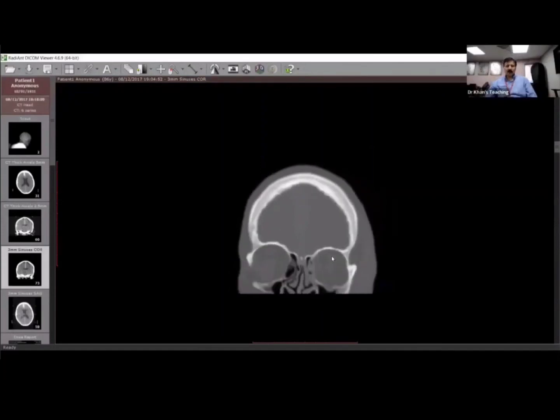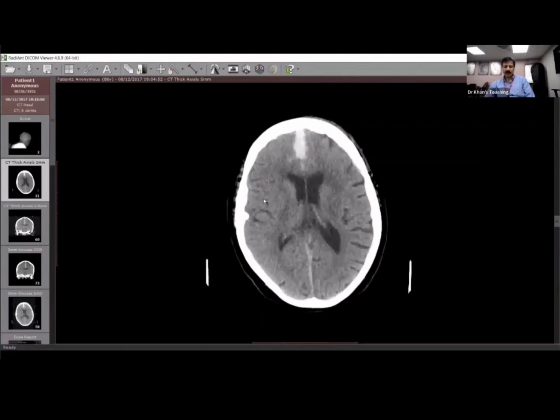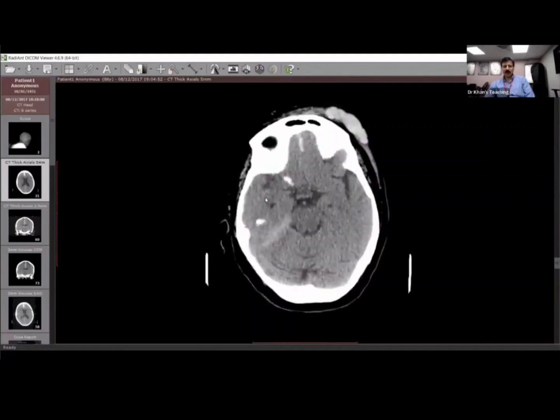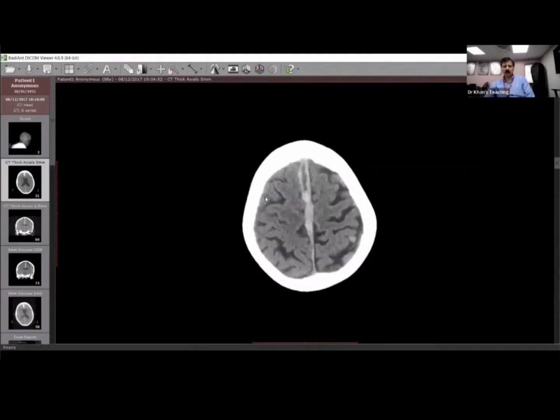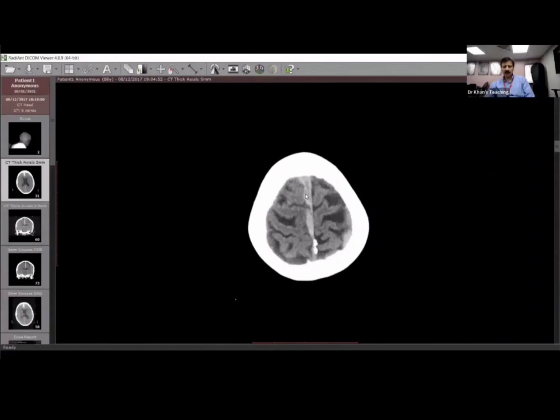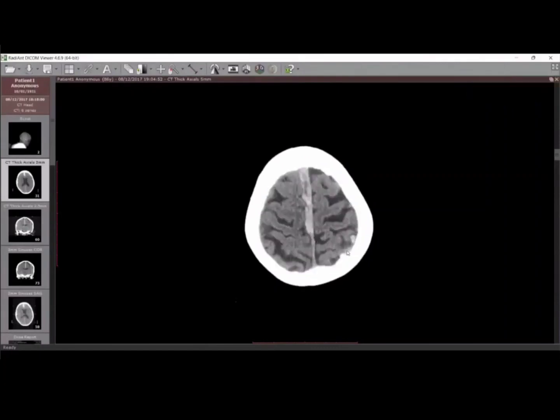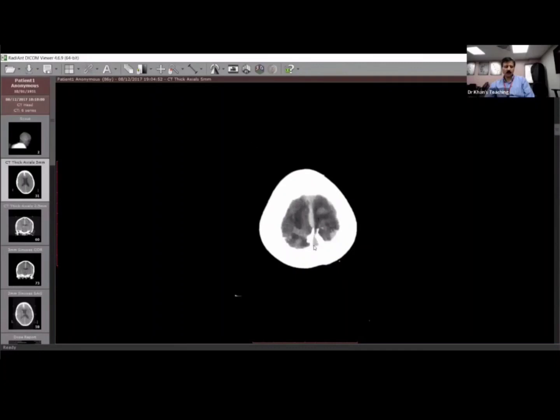So you see, now ultimately you did reach it, but what is the lesson? Satisfaction of search, right? In trauma cases, always, what is satisfaction of search? First of all, you picked up the findings. Even here, there is something happening here, right? Did you see this? Something is happening here. Now, this something, what is it? So let's have a debate what it is.